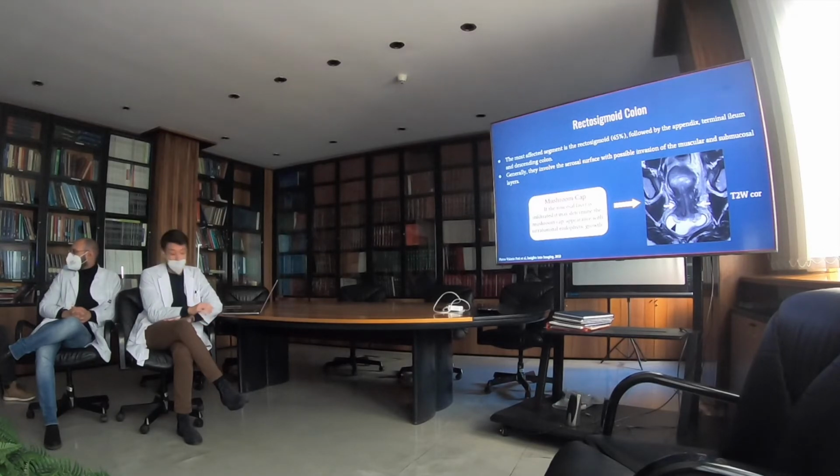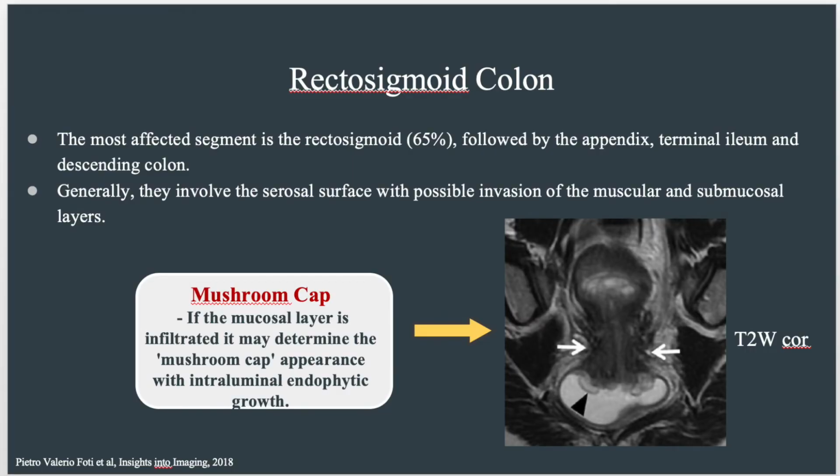Sorry, you do both examinations with an empty and a filled vagina? Yes, with gel and without gel. And the white arrow indicates the obliteration of the posterior fornix, which is more easily visible.